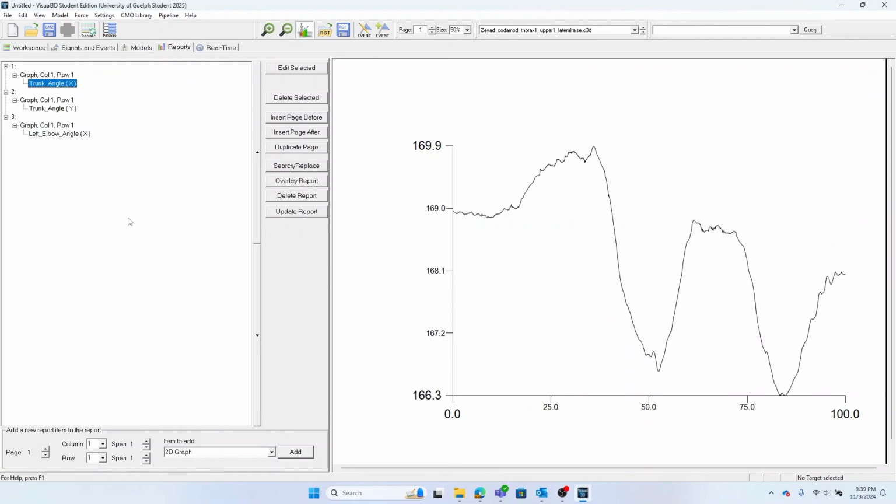Obviously, this is just showing you a preview. For the most part, if you were to use this in your reports, you will most likely lose a lot of marks because this is an incomplete graph and you most likely want to do some processing on the data. You might want to clip it, average it, you do you. So moral of the story is we want to export this data outside of Visual3D to use it and to process it further.